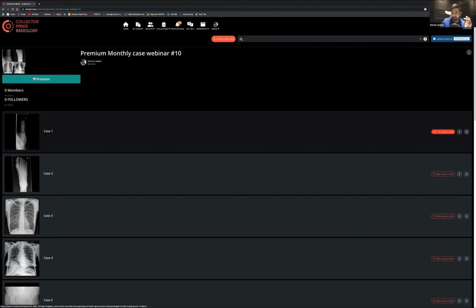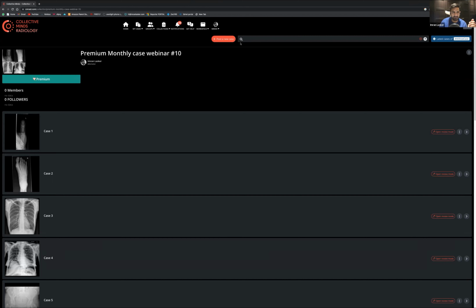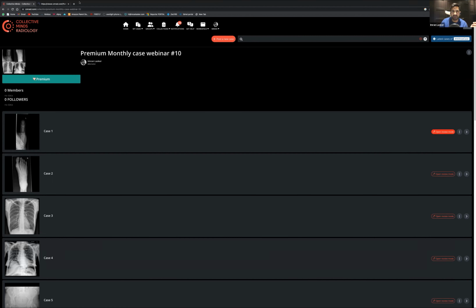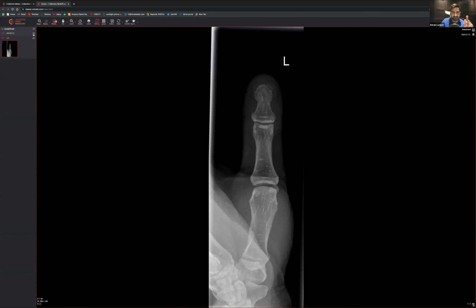The link is now in the chat. Thank you, Seidel, for putting that through. Hopefully you guys can all see it. I do keep track of the chat, so if any questions come up, I'm pretty good at picking them up as we go through. The way we do it is we just open each case. I generally open a new tab and then we have a look. And one of the key tips I'd say is that you see that little cloud in the corner, press that just to make things slightly easier.